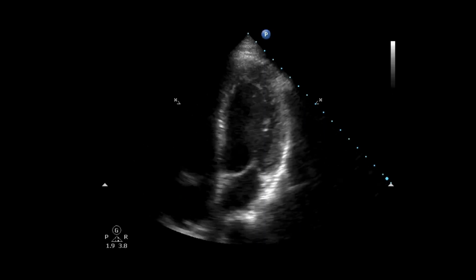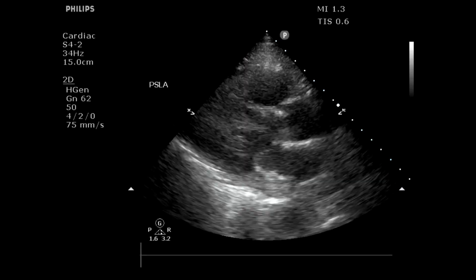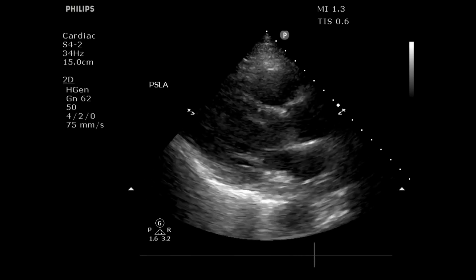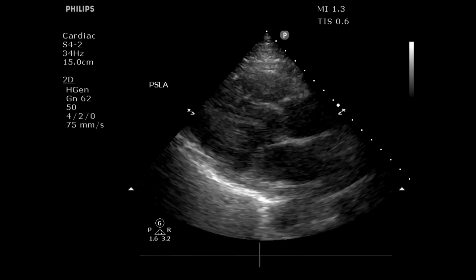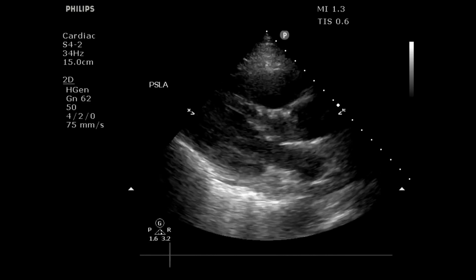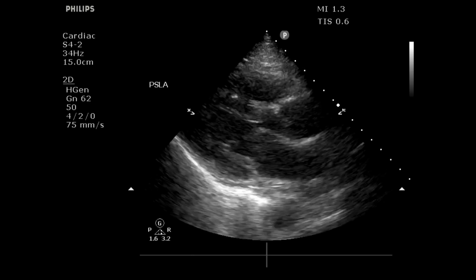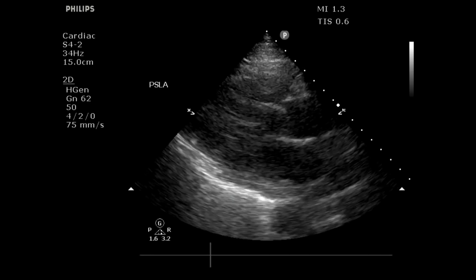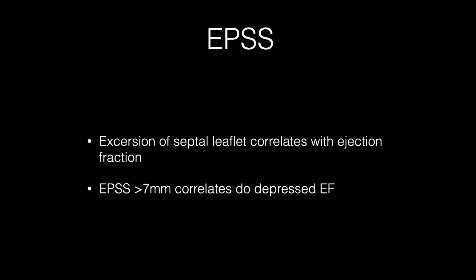Compare that to this one that has a little bit more of a normal squeeze. It has a very different profile, very different picture. And this one, it tends to be a little bit more hyperdynamic. So we see a near complete obliteration of the LV chamber, right? You have those kissing ventricles as the ventricular walls touch one another, suggesting that this patient has a large proportion of the blood that is in the chamber being ejected out of the heart.